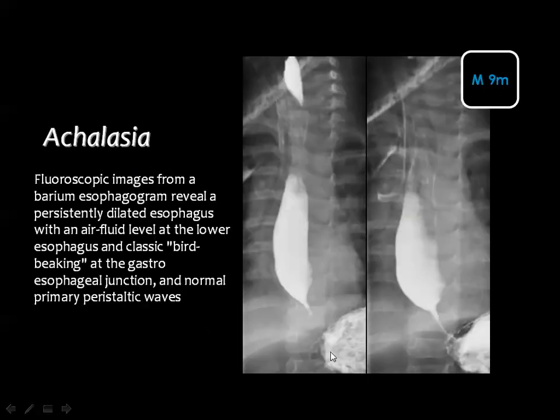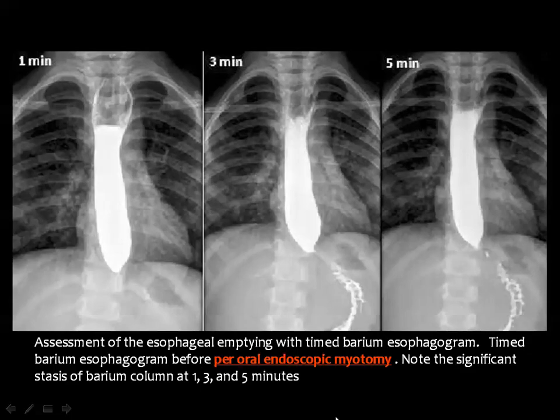of the esophagus proximal. And you see here that the esophagus is dilated and is harboring a lot of barium with smooth tapering or narrowing of its distal part. This is known as the bird's beak sign or the parrot beak sign. Whenever you see that the distal segment of the esophagus is smoothly narrowed with proximal considerable dilatation.